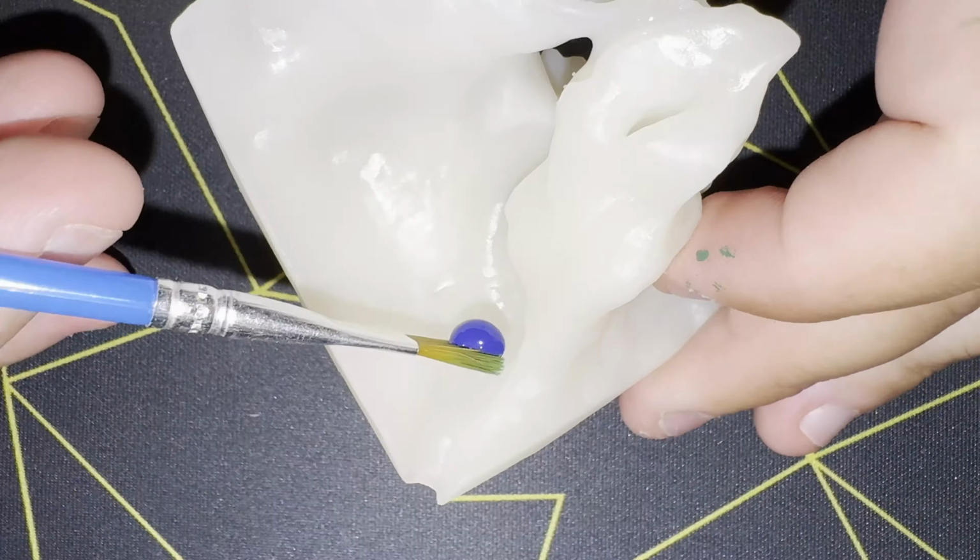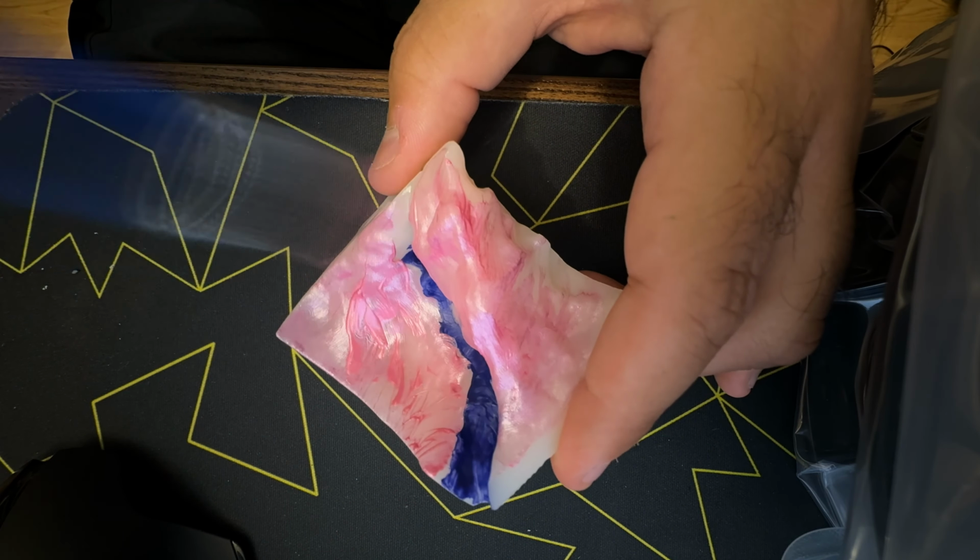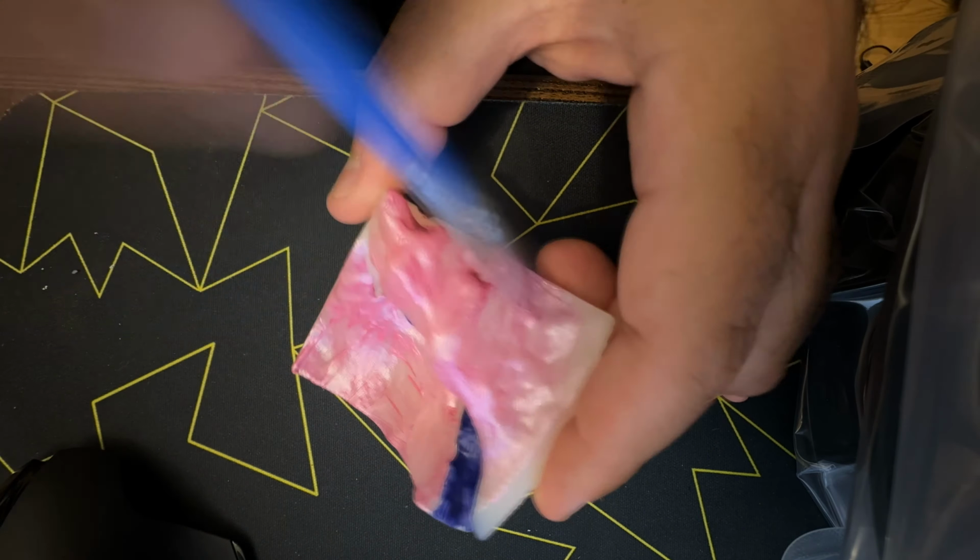Now we'll have to do more post-processing. I used some acrylic to paint the sigmoid sinus in blue. I'll show you at the end why it's important. It allows you to see it when you're drilling. Same for the dura. Use some metallic acrylic in pink and then some yellow for the facial nerve. And I fill it with plastic filament as well. It is now ready to be drilled.